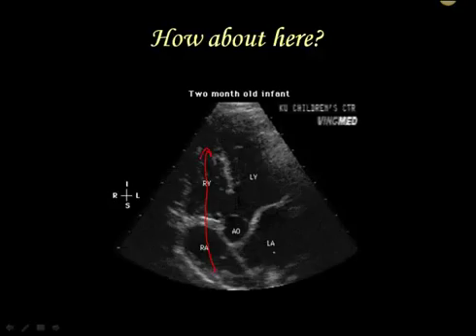Now, this is showing you the four chambers of the heart, and the way this is angled, because now this is an echocardiogram. Okay, the way this is echoed, we've got the aorta right here, and they're just sort of circling around. In essence, if we took this and flipped it 90 degrees, because you can see what we've got here, okay?